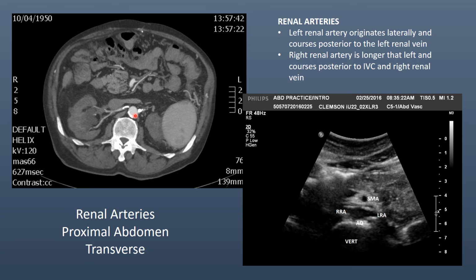The liver is larger than the spleen, and so there's not as much effect on the left side as there is on the right. So in this view on the CT, once again, aorta, right renal artery coursing here to the kidney, and left renal artery. We don't see the complete portion of it, but just the origin in this particular view on this particular patient. Here is left kidney, portion of the spleen. Got a lot of bowel going on here, got some bowel gas.